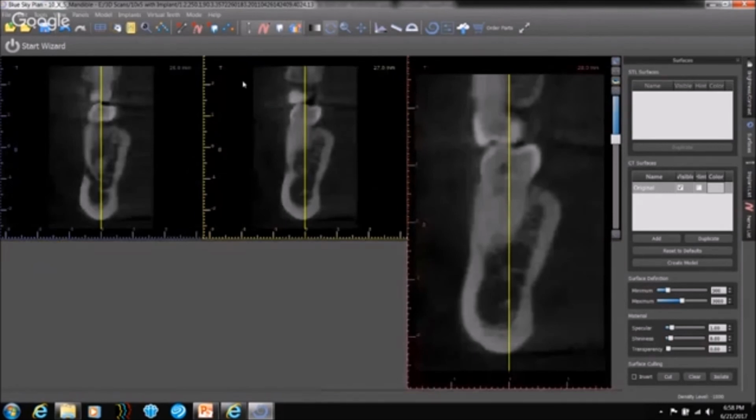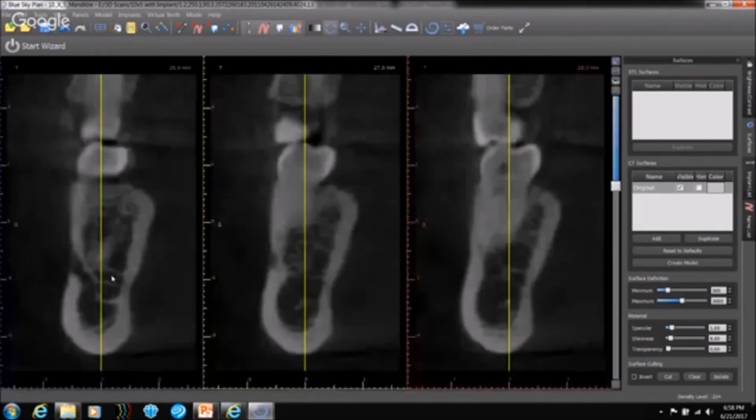What typically happens is because of trabeculation, sometimes there are some empty pockets that happen, and this is very common. The only problem is, a location like this gets a little bit confusing when it's right next to the canal. Now it could be superior, it could be inferior, but it's a good possibility. Now typically these empty spaces, these bone marrow spaces, can happen in any type of bone, but generally it happens in a slightly aging population.